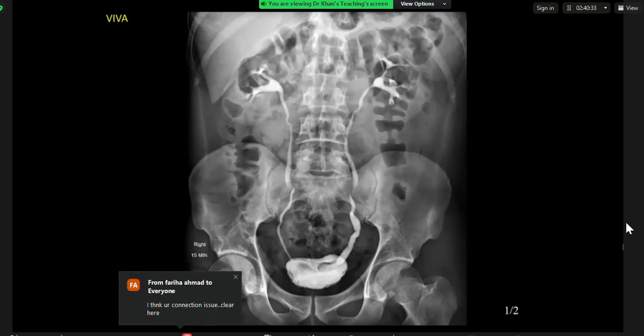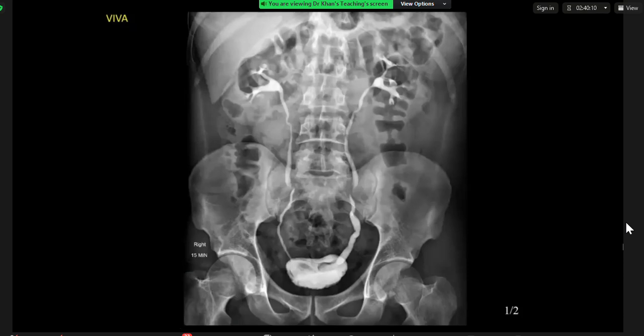They pass through the normal expected location for the ureters and are not displaced, and I can see them filling the bladder. On the left-hand side, I can see an expanded ureter within the bladder in keeping with a ureterocele. It's not causing any significant obstruction or reflux.